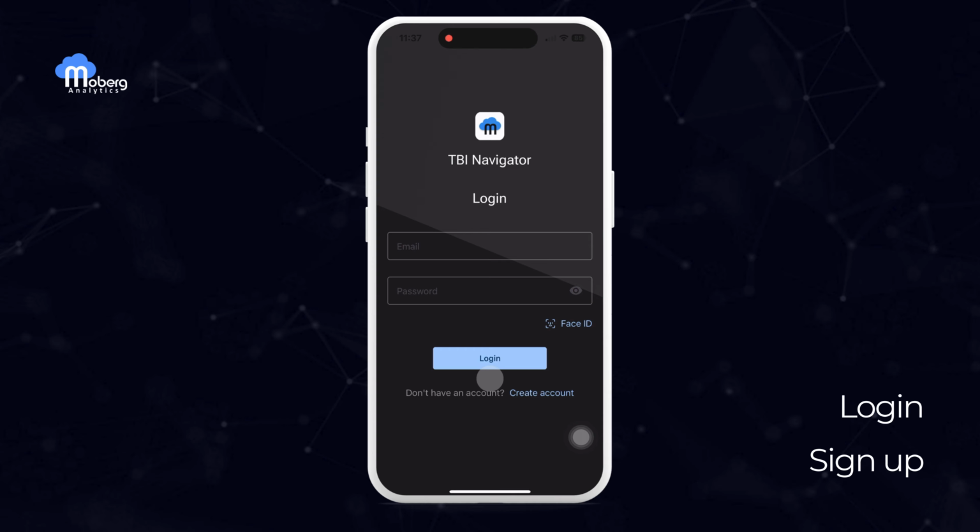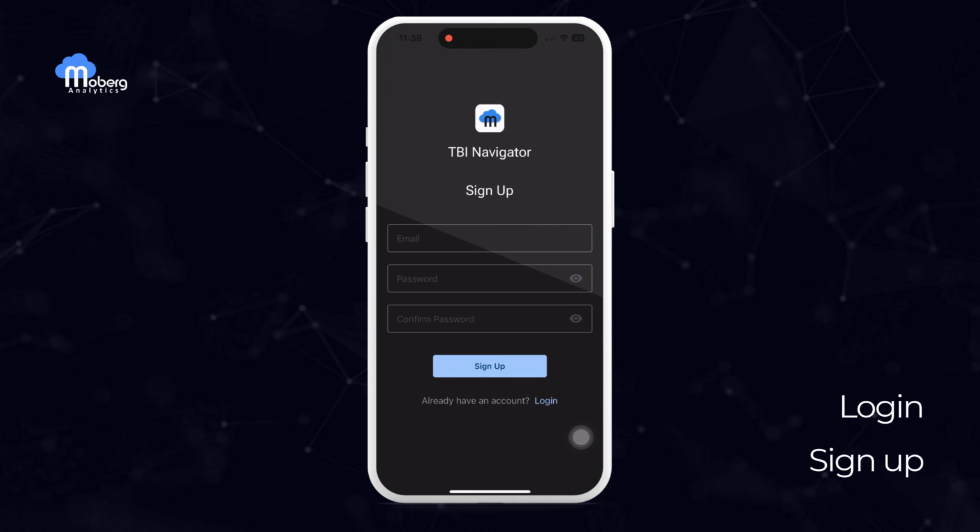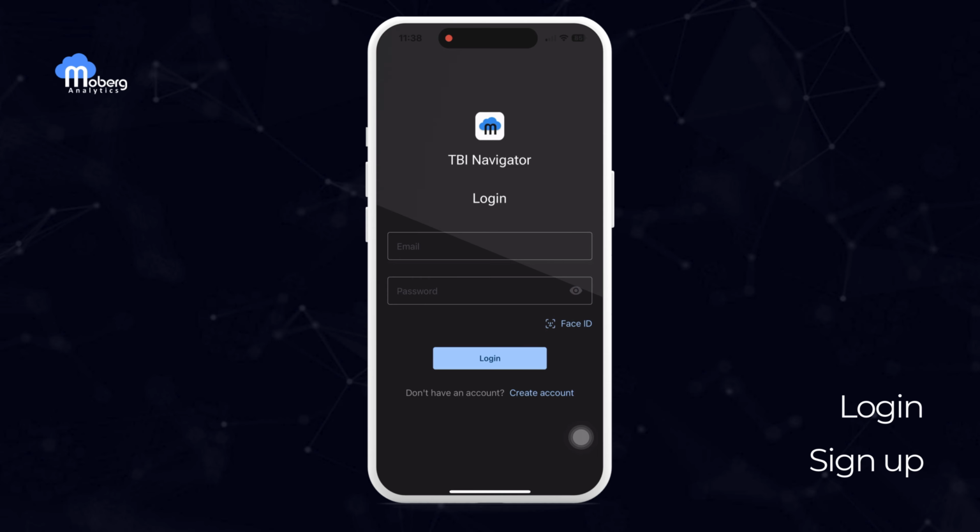To get started with the app, we begin on the login screen. Here, you can log in using your email and password, and there's also the option to enable Face ID for quick access, which will pop up during your first login. If you're a new user, there's a simple sign-up page available too. For this walkthrough, I'll go ahead and log in directly.